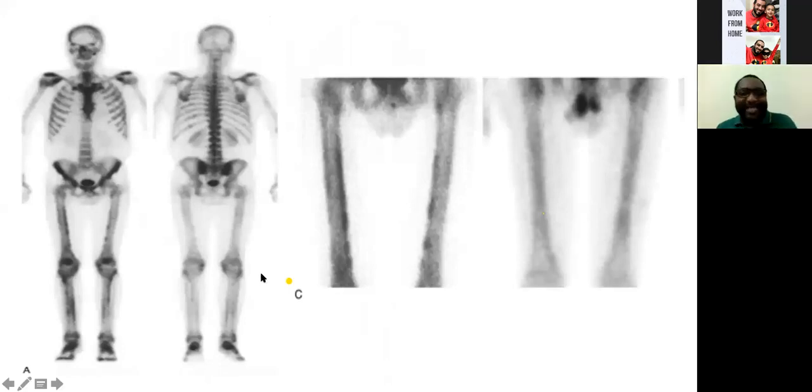Now, in lung cancer, you can have a different pattern of metastasis. Now, again, this is a 46-year-old male patient diagnosed with an adenocarcinoma of the lung, and he's sent for a bone scan to exclude or to detect the presence of metastasis. Now, if you look at this, this is a whole body bone scan, but remember that part of this has been cut off, all right? So be careful if you want to interpret the scan. You need an additional view, because this is not a proper whole body scan, as you are not seeing the entire upper limb. You can ask for an additional view.